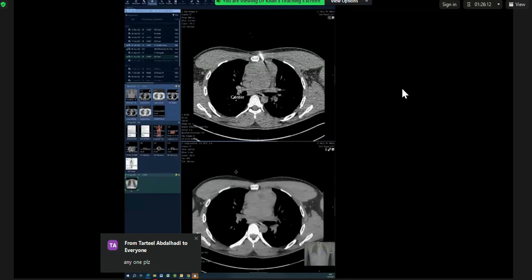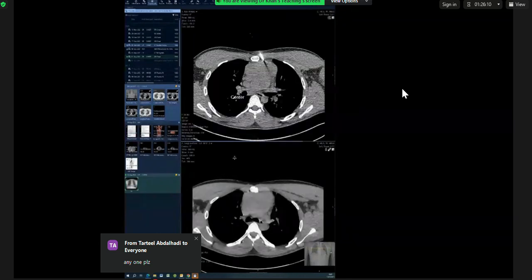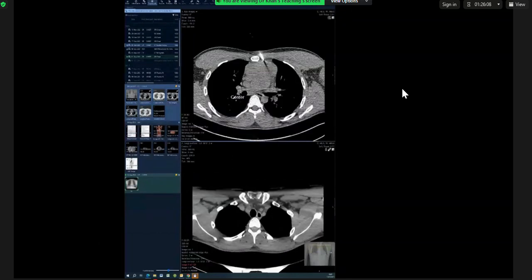They want you to say, I don't see any calcification in it. I see some low attenuation within it, suggestive of a degree of necrosis. I am following it upwards. It does not seem to communicate with the thyroid. Things like that narrow down your differential a bit more. So after the CT, you would say it doesn't communicate with the thyroid, so I am excluding thyroid and leaving me with lymphoma and thymic, etc. as the more plausible differential diagnosis.